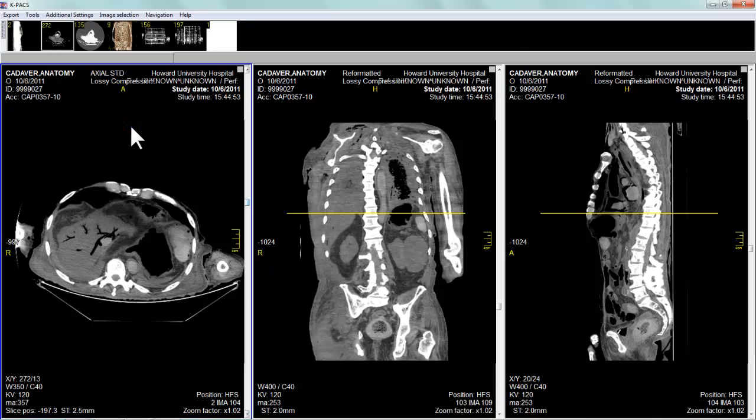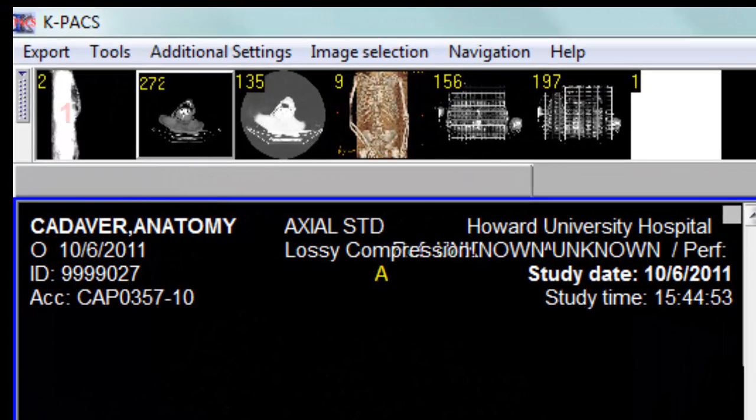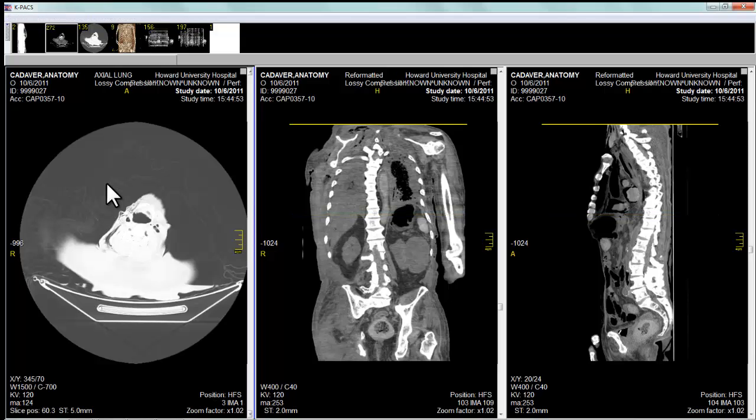And you notice that these axial sections are taken from our second stack of raw CT images. If we go up to the left-hand corner, we can see the possible image stacks that we could display, and the second image stack is located at the cursor, and there are a total of 272 images in the stack. If I want to display the next stack of raw CT images, I go over to the next block here, left click, keep the left click down and pull the image into the window. So this will be the third stack of raw images, and once again you see that the number has changed to 3.